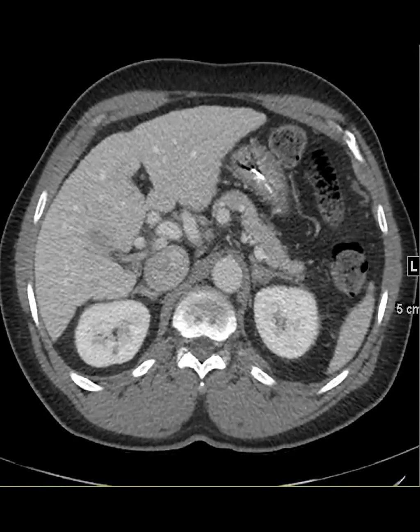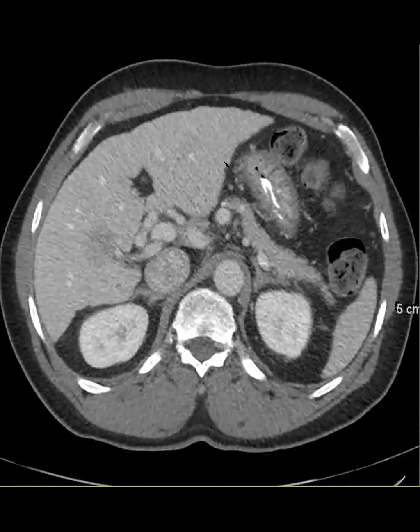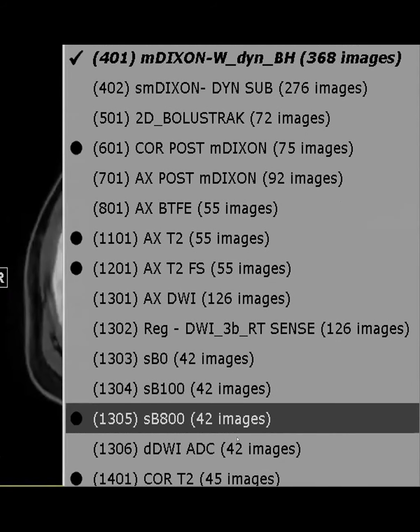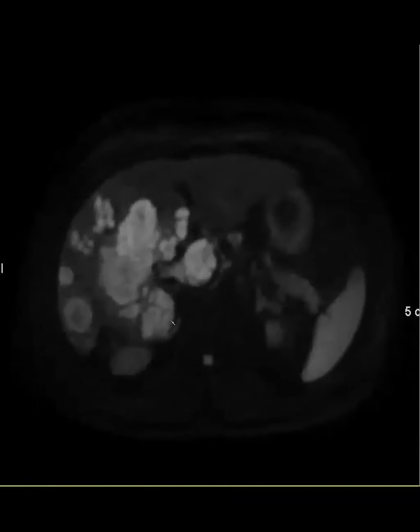But it's interesting that the first one looked not arterial enhancing, hypoenhancing. So I would have thought maybe cholangio, but then with all that tumor in vein, it looks much more like an infiltrative HCC. Well, in a case where I don't have the arterial enhancement, the AFP can help you clinch it. Like, okay, then that's definitely HCC.